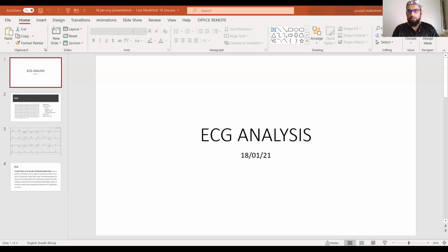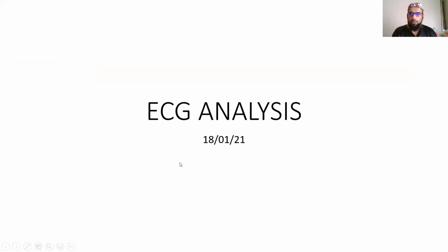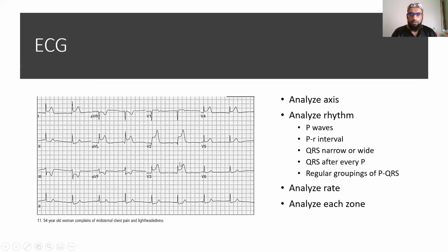So in this case, what we're going to do is quickly go through an example of ECG and your approach to these particular patients. Okay, so let me just start from there. Slideshow going over there. All right, good. So let's have a look and see.